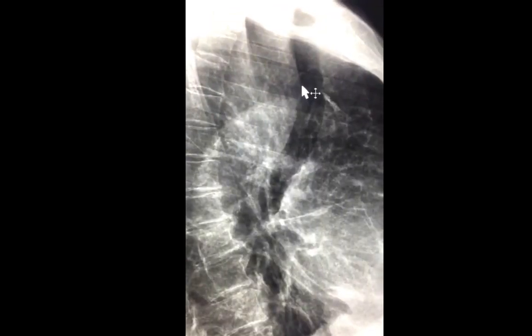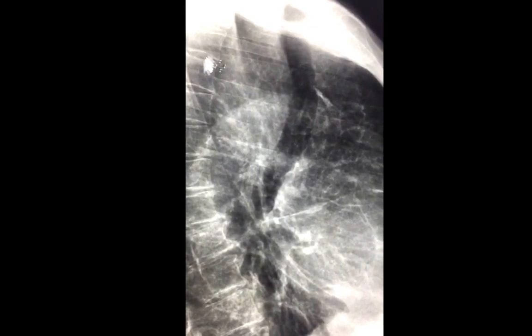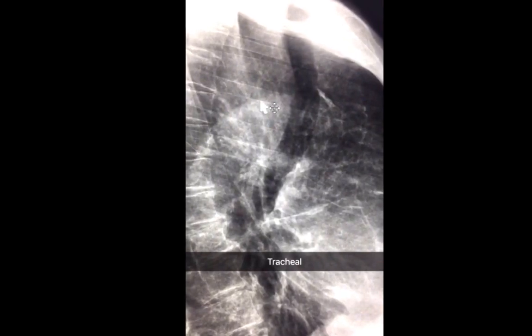Now a bit of discussion for the seniors. The retrotracheal space is bounded by the trachea, the aortic arch, and the spine. So the differential diagnosis of something that fills the retrotracheal space would depend on these anatomical structures and what lives in the space itself. Tracheal neoplasms may give you a retrotracheal opacity.